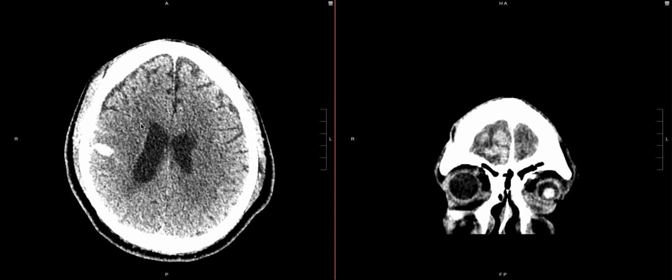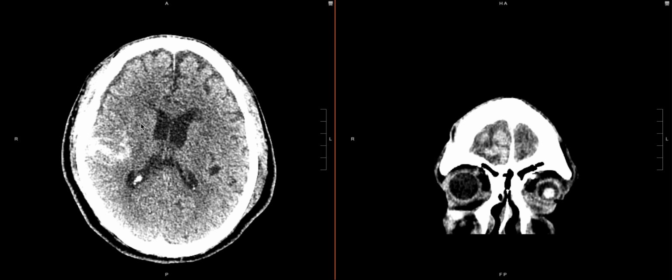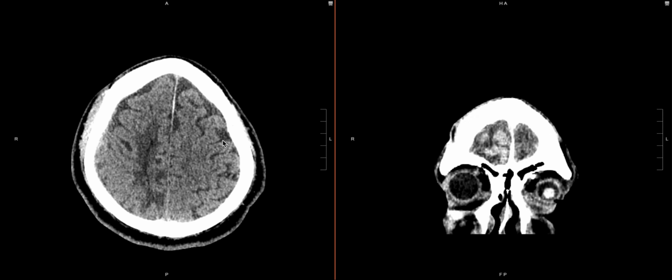We see intraparenchymal hemorrhage. There's subdural hemorrhage, but there's also subarachnoid hemorrhage. So it can be really easy to just look at this on some of these traditional brain windows. It's a little too harsh. We'll do something like that, and then just kind of say parenchymal subarachnoid, and then move on.